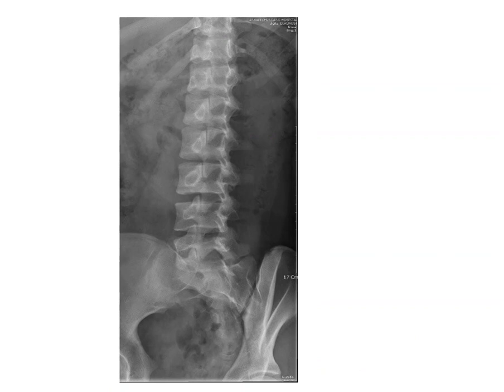All right, so let's look at the anatomy of an oblique lumbar vertebra X-ray. This image is done in different obliquities depending on the part of the spine that is of interest, but routinely it is done at a 45-degree oblique rotation of the patient's body. By looking at the ilium, I can identify what position this patient was in.